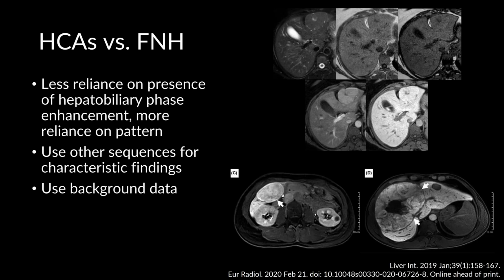And so some FNHs don't take up Gadoxetate, and now we know that some hepatic adenomas do take up the contrast, and in fact, it's the ones that have the increased risk for malignancy that take up the contrast. So it's not going to be a black and white picture. It's more of what's the enhancement pattern of the lesion, and also what does the lesion look like on other sequences, and also what is the background clinical picture of this patient.